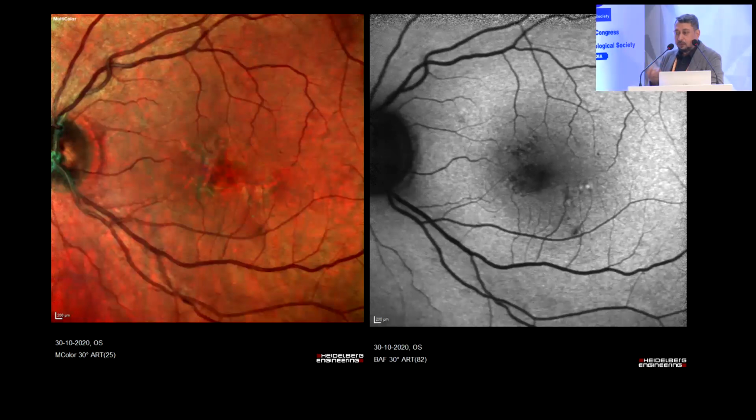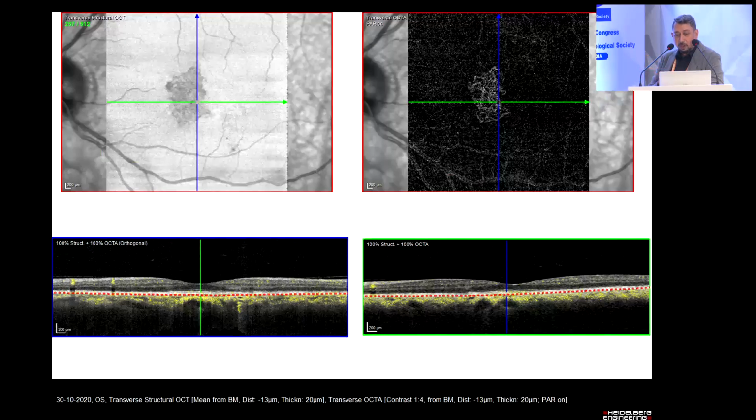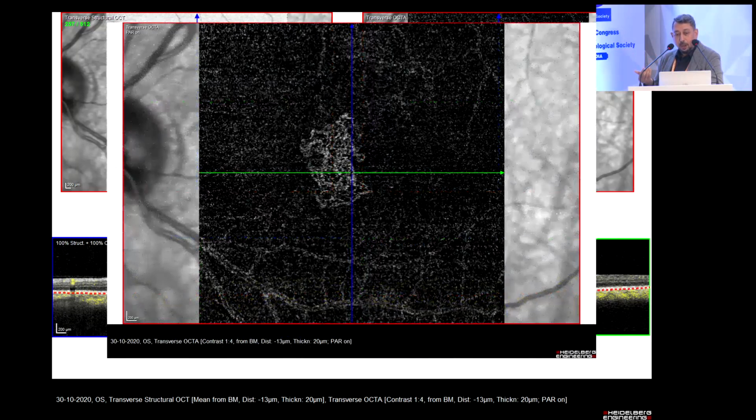The last thing that the OCTA has revealed is something called a non-exudative membrane. You see a small ripple or a double layer sign. There's no activity, but on the membrane, on an OCTA, you see a very faint vascular network. It is non-exudative. It has not yet reached exudation. And that is the thing.